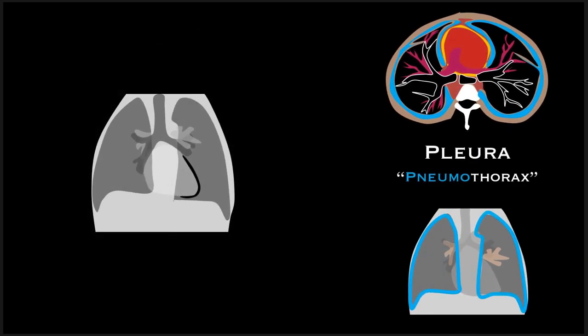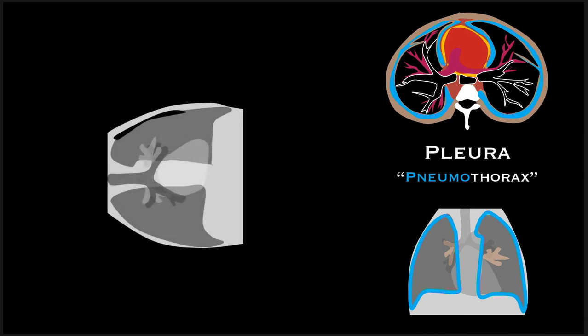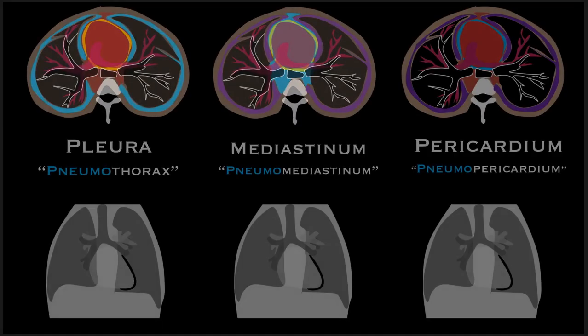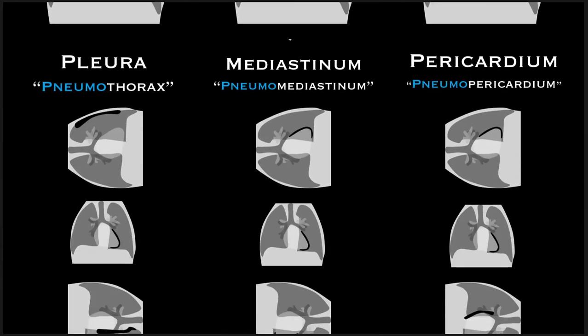Now, pneumothorax, when we turn the patient on the side here, it's going to rise up, right? Again, it's going to rise all the way to that most lateral aspect of the pleural sac adjacent to the chest wall, and if we turn the patient around, it should again rise all the way up. It's trying to float, and it's limited by that pleural sac, so that's how you would expect it to look. So a quick summary here again. These are our 3 choices. I'll move this up here.